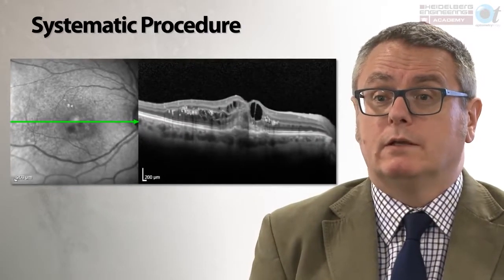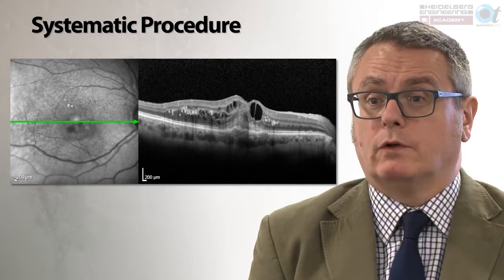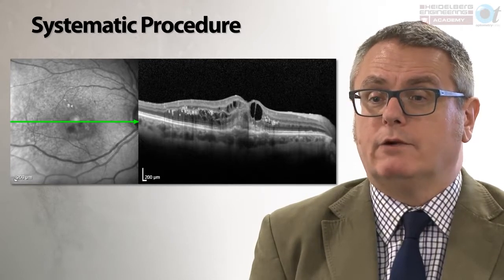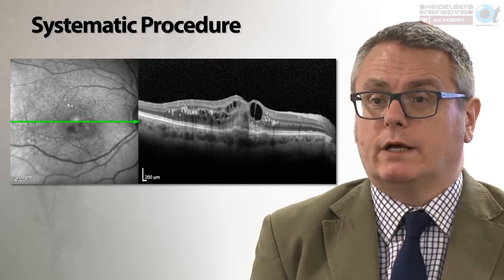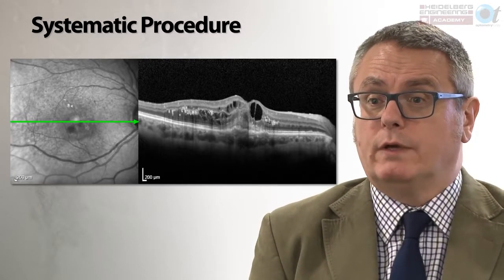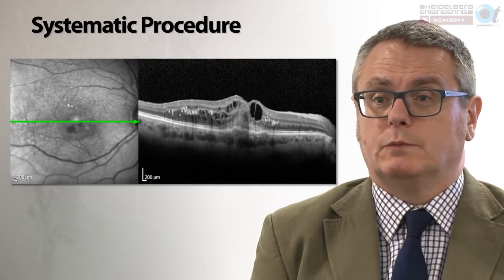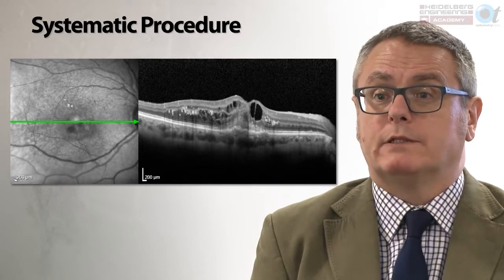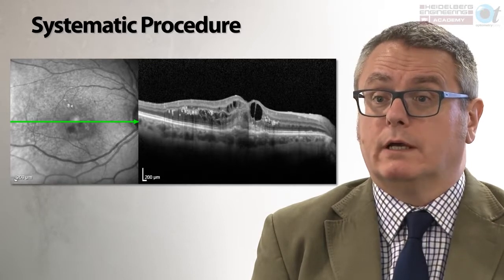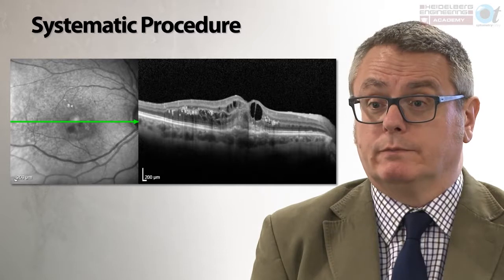When we look at the OCT scan now, have we got a good quality scan? We've got a good laminar structure to the retina. The inner and outer retinal bands are visible. It's a high quality scan. Are we scanning through the fovea? If you examine the scan carefully, you'll note you can visualize the position of the retinal nerve fiber layer and the outer plexiform layer, and they do appear to meet at the fovea, although the foveal depression appears shallowed.